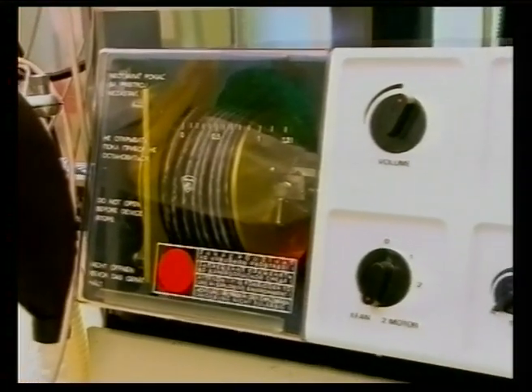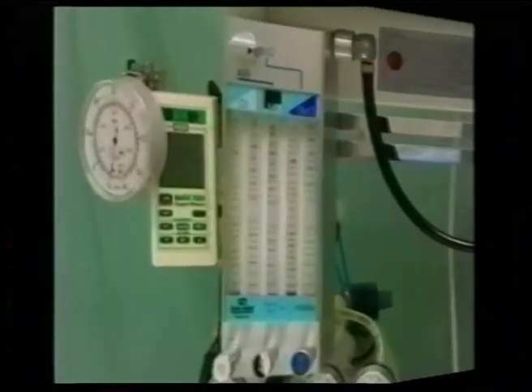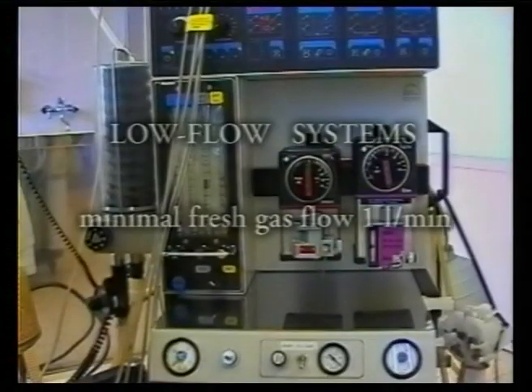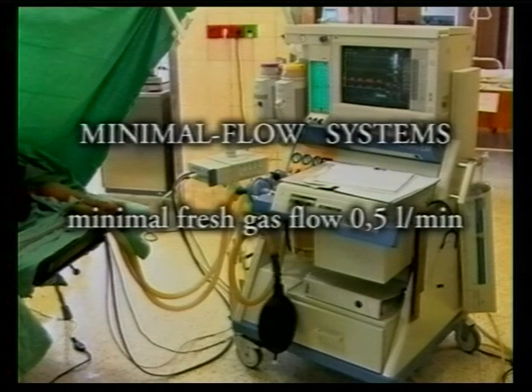Anesthetic machines can be divided into three basic categories according to their quality and gas leakage. Standard anesthetic machine, where the minimal fresh gas flow is 4 liters per minute. Low flow anesthetic machine, where the minimal fresh gas flow is 1 liter per minute. And minimal flow anesthetic machine, where the minimal fresh gas flow is half a liter per minute.